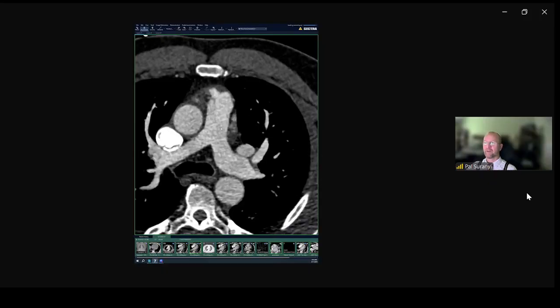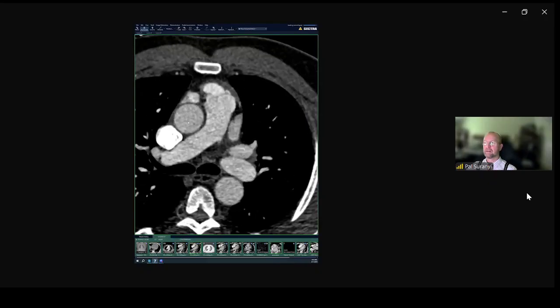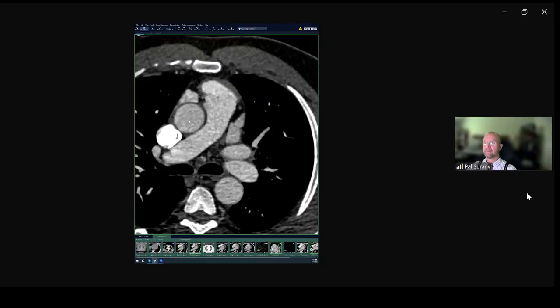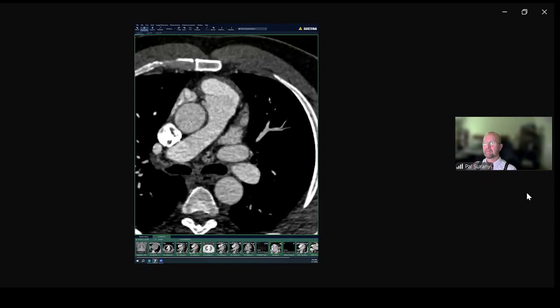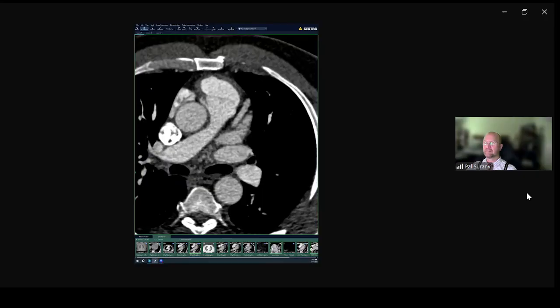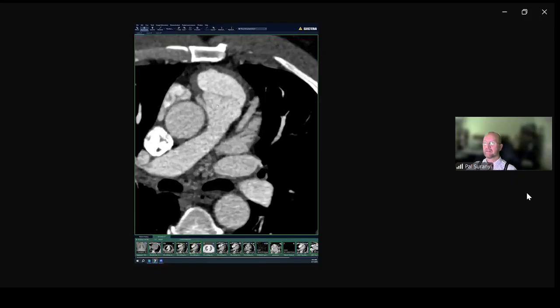Coming from the pulmonary artery here, ascending aorta over here. Scrolling down slowly. Getting to the level of some coronaries here. Here's our pulmonic valve. I'm going to use Dr. Glanz and Dr. Grafy's trick.